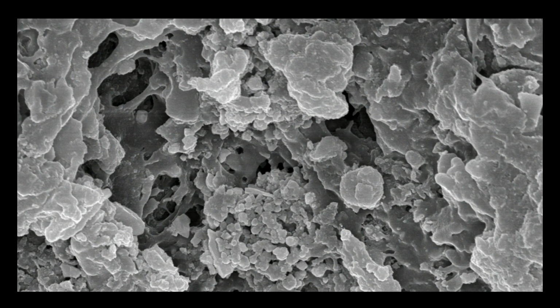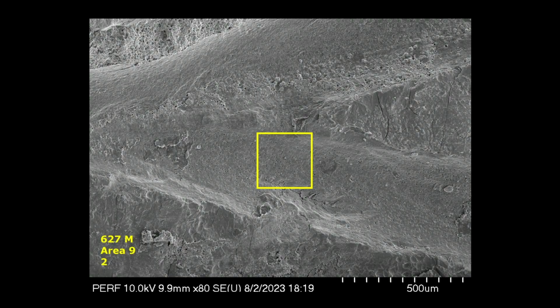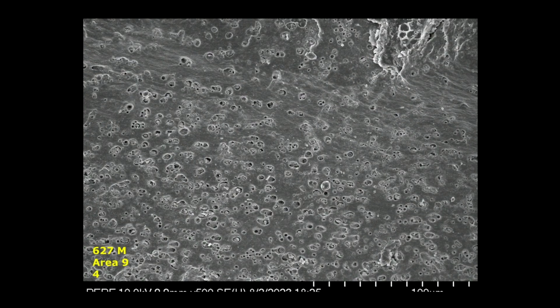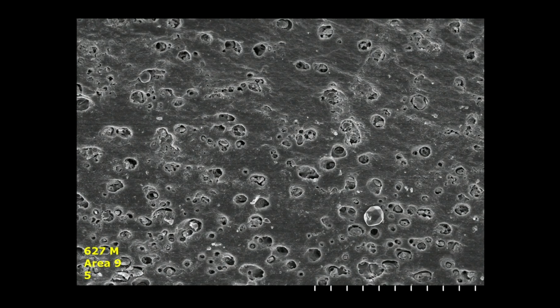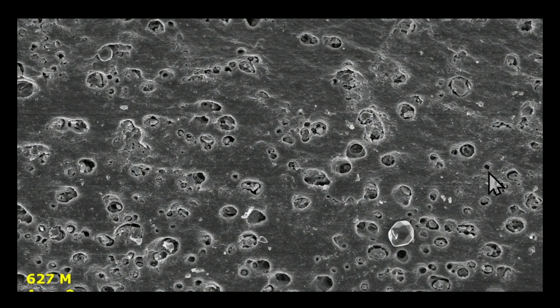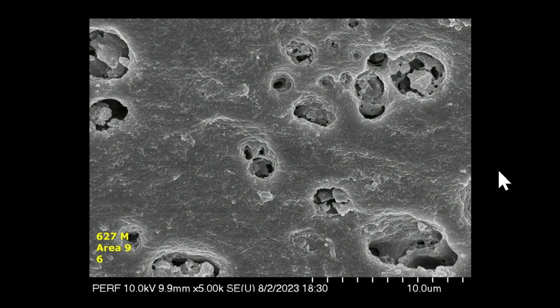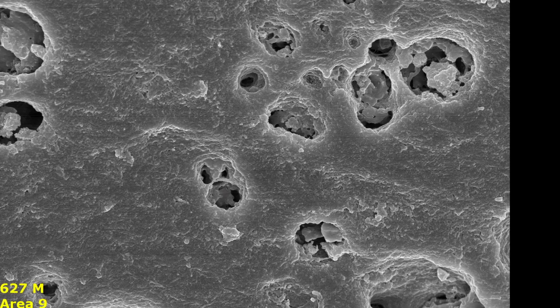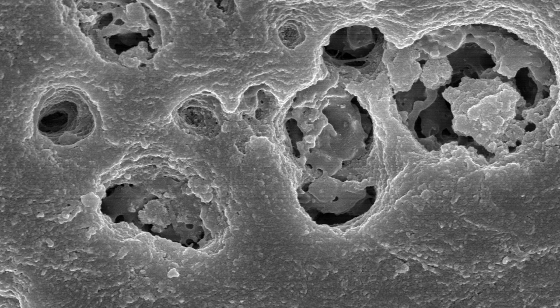In area 9 of the mesial root, where the canals meet, we again get a very good look at the naked canal wall in the mineralization front, where there is minimal predentin present, but where the peritubular dentin has not been demineralized. So it looks like all the predentin has been removed, but there has been minimal demineralization of the peritubular dentin and minimal demineralization at the mineralization front.